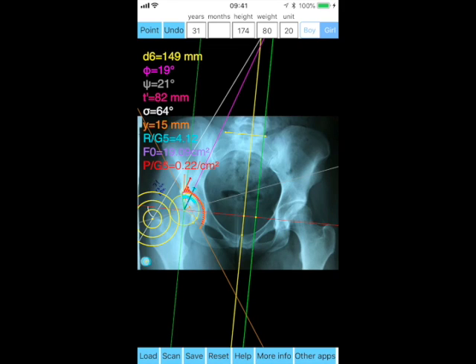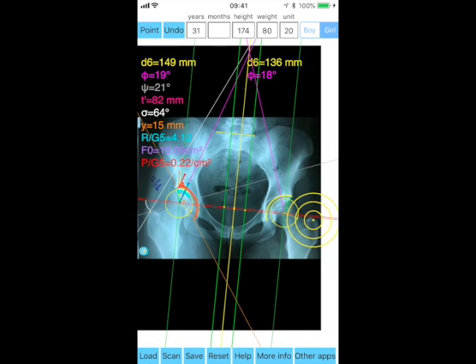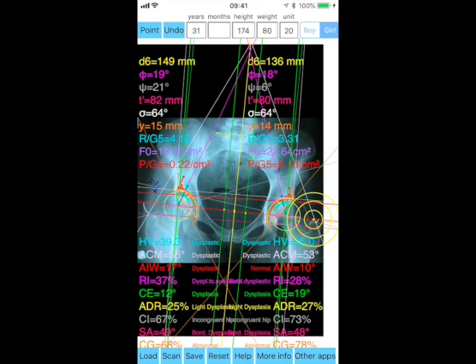Left side: without recalibrating, you start the same procedure from the left side by marking the center of the left femoral head C13, R14, and as mentioned above, with the same order you mark the rest of the points at the left side as follows: E15 lateral acetabular margin of the acetabulum, A16 deepest point of the roof of the acetabulum or the triradiate cartilage, V17 acetabular teardrop, D18 intersection of the femoral head at the posterior-inferior acetabular margin, T19 insertion of the hip abductors on the greater trochanter.